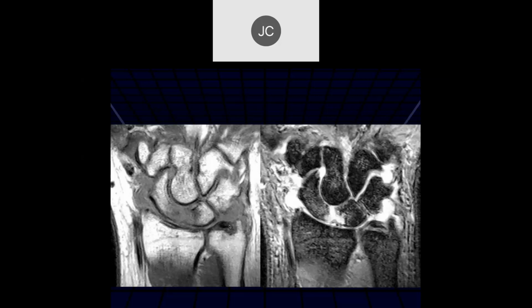But you can see how gout can look very aggressive, almost like neoplastic tissue, until you look carefully at how it's happening and what the details look like. Okay, Elior?